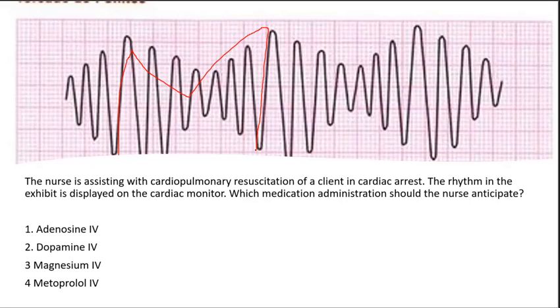But again, you can see this one is a ventricular tachycardia with multiple shapes. So this will be called a polymorphic ventricular tachycardia, or Torsades de pointes. You're going to see the QRS complexes that keep changing in shape and in size in a characteristic twisting pattern. And most times it's due to a prolonged QT interval, mostly as a result of electrolyte imbalance. Which electrolyte? Your magnesium. So again, it's usually caused as a result of hypomagnesemia. That's one of the most common causes.